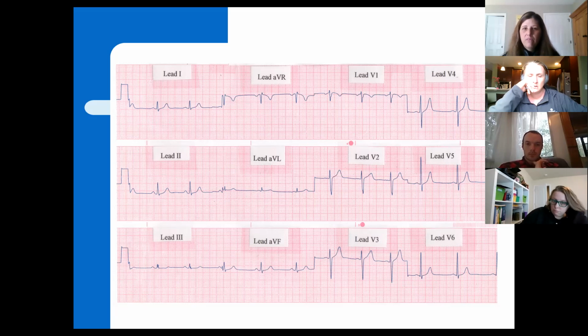That's not really enough. That's not even 3 seconds. That's not 6 seconds. We can't determine what the rate is. So having that 4th row at the bottom, and typically it's set again on lead 2, it will give us a full, 6-second or maybe even longer picture of that one lead and help us to see what the rate is and if something is regular or irregular.